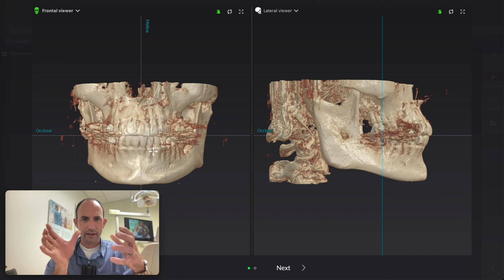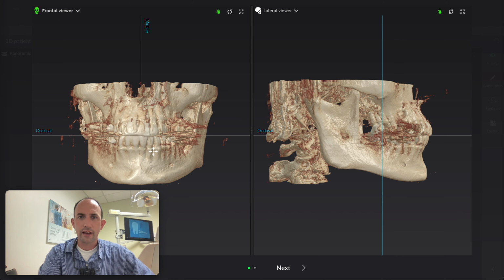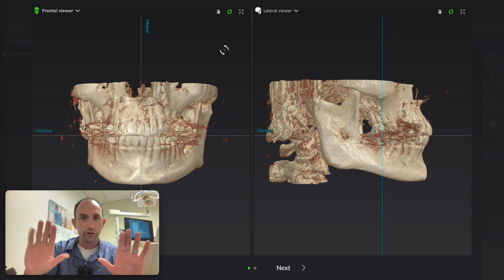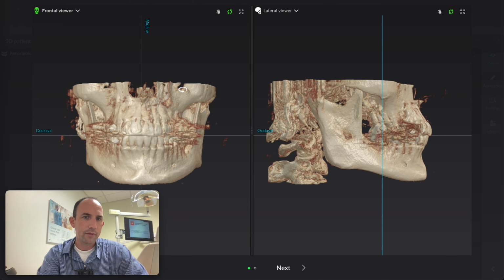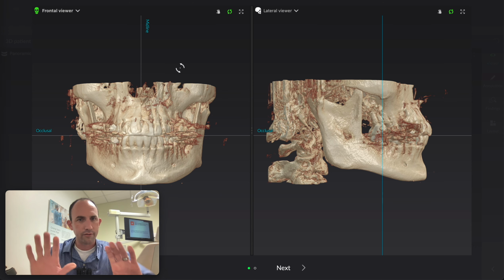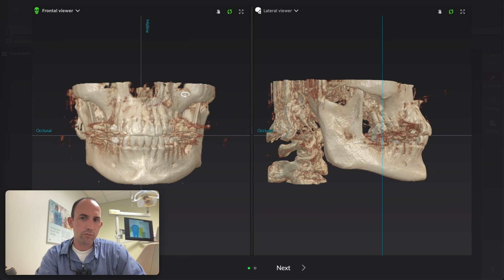You can see the patient's head is rotated just a little bit along the axial plane. So I'm going to rotate it a little. Now if you'll notice here I'm rotating it along the coronal plane, but I want to rotate it along the axial plane. So you see this? See how the cursor is changing as I'm rotating and moving it down? So now I'm going to rotate it around a little bit. Many people don't know that the cursor will do that. So rotate it in the coronal plane versus the axial plane. So make sure you put that piece of information away. You may need it in the future.